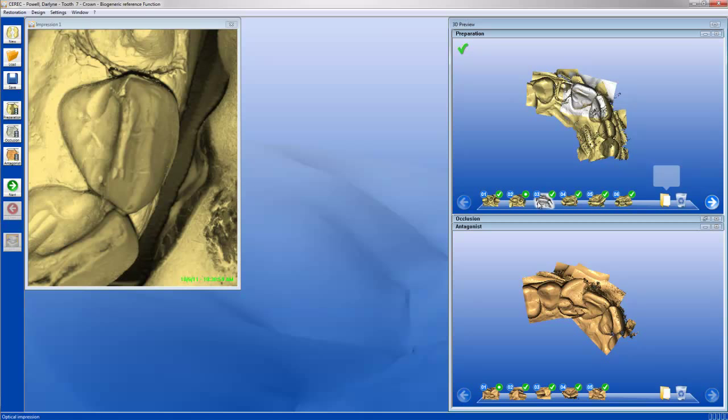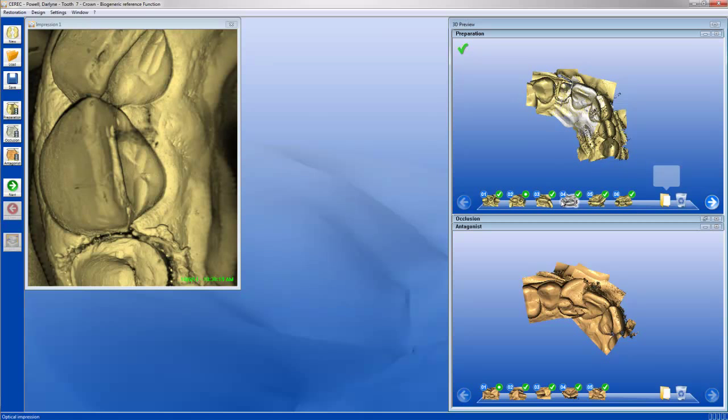The next image here, look at how much cleaner this image looks here. Next image here. Now here's an image that there's a lot of shakiness, and hopefully the arrows that I've drawn, you can see the shaking of the images. So every time you have a shake in the image, it'll lead to that model distortion that I talked about earlier.